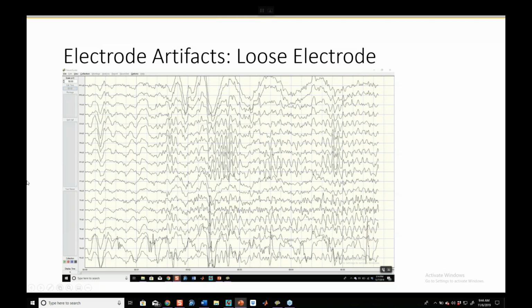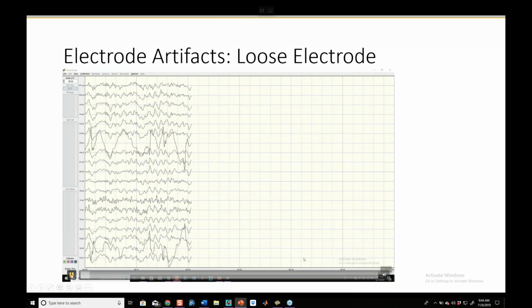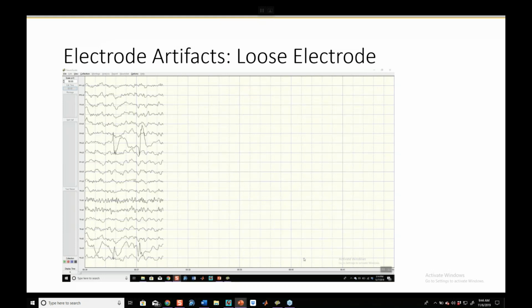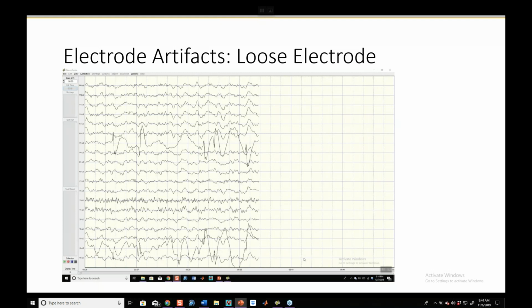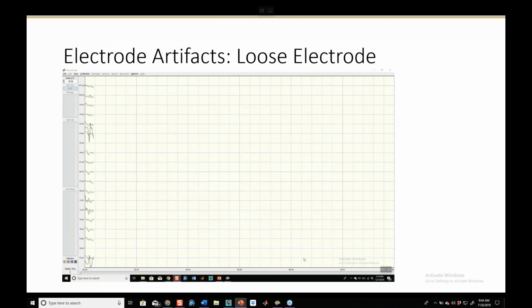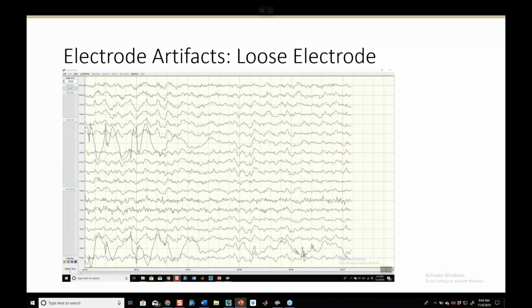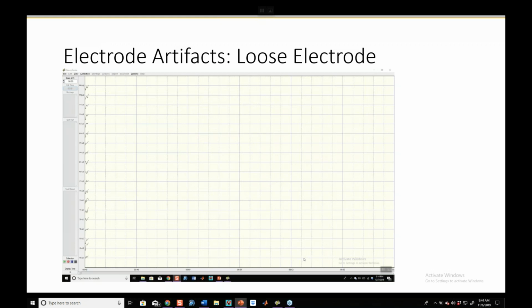of loose electrodes. This is a particularly sneaky recording, because in the beginning here you see, wait a second, are they sharing field and phase? Are they doing the same thing? It almost appears that way in the beginning, but no, actually they're not. One could not fit into the other, right? They are not doing the same dance, although it's variations on the theme, but we certainly have artifact because we have two electrodes in this case dancing to the beat of their own respective drums.